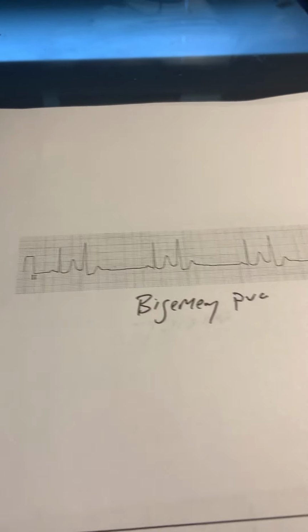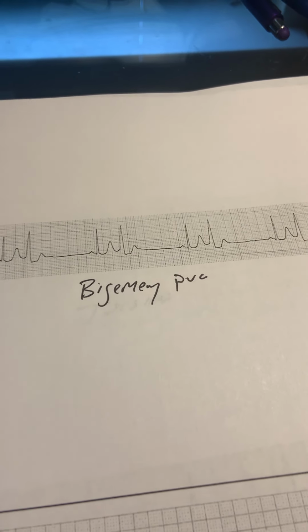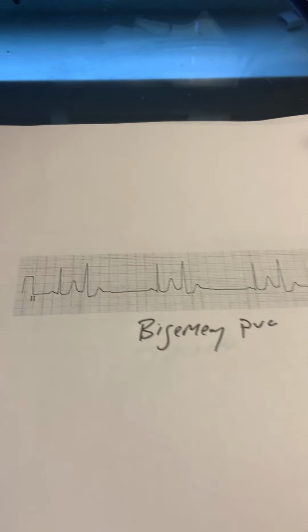So we'll go ahead and I'll start with some rhythms here. As always, if you guys have any questions, post them in the comments and I'll try and answer them. So this is just how these printed. I tried to print them off as well as I could.